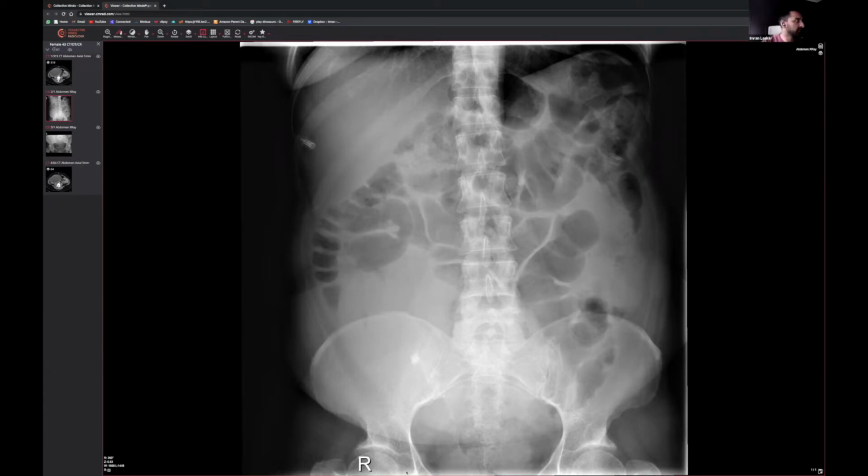Now, for those of you that are quite eagle-eyed, you can see that there is, well done, what looks like a calcification sitting within there. So when you've got calcification sitting within what looks like a pelvic mass, someone may say you could get fecalith material. Fecalith material sitting within the appendix can get calcified, so you can get an appendicitis or an appendix abnormality that has calcification with it. Other things that can have calcifications: you can get calcifications of lymph nodes, all right? That could be previous TB, it could be ongoing sarcoidosis, and I think you can get calcified lymph nodes when someone has had non-pasteurized milk over time, and obviously previous infection.